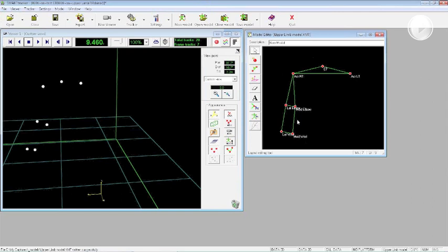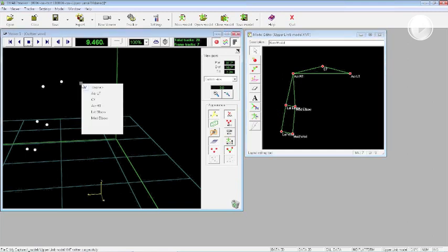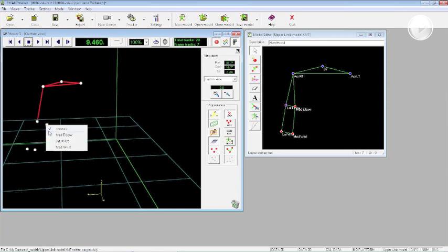But now I need to tell my trial that this is the model I have to be referred to. So I select the marker, just by clicking on the marker, and I select which is the name of the marker that we are using. Acromion, C7, acromion on the right, lateral elbow, medial one, lateral wrist, and medial wrist. You can see that basically automatically all the connection that we create here, we can see it over here.